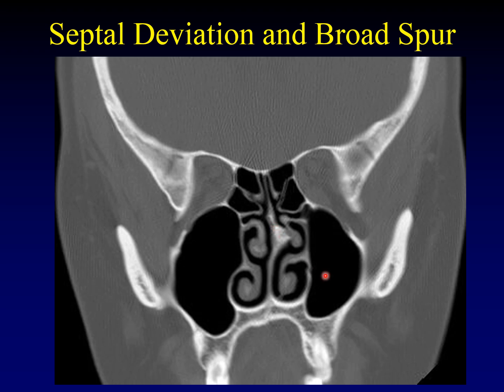Another important thing to mention when you're talking about septal spurs is whether they contact other mucosal surfaces and whether they cause remodeling of other structures. For example, here, this spur contacts and deforms the middle turbinate. When two mucosal surfaces touch like this, it can cause pain, and that pain may mimic the pain of sinusitis, so this can be an extremely important finding.